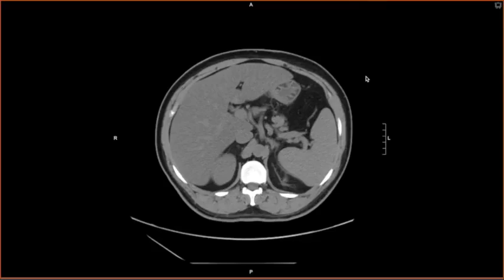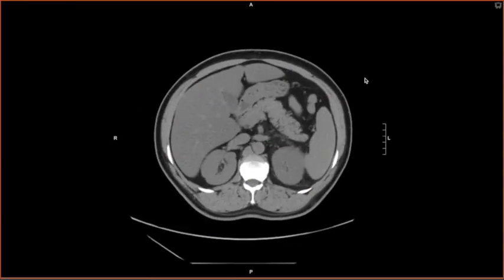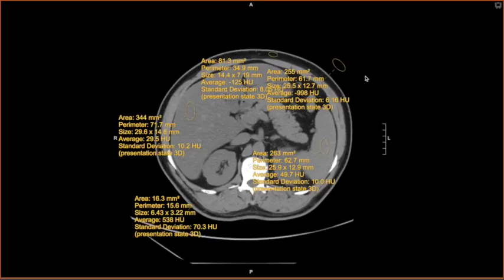Just to show you some of these densities in number format like we've been looking at, I've put an ROI, or a region of interest marker, on some of these areas. What that does is it averages the density, or the Hounsfield unit number, within that particular selected area. So we'll start here. In the upper right corner of the image, I've selected an area outside the patient, which is air, which we said by convention is about -1,000. If you look at the average number, that shows -998.